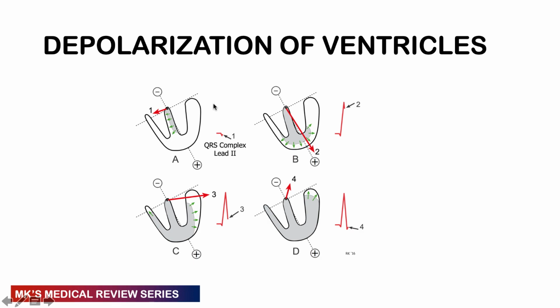So there'll be a negative wave that is seen on this lead, which is of course V6, which is on the other side. On the other aspect, this lead which is facing the heart from this direction, which is V1, will show a positive deflection. Because this current is spreading towards the right side of the heart, eventually to depolarize the right side of the heart, the vector will be moving in this direction, going towards the apex of the heart.